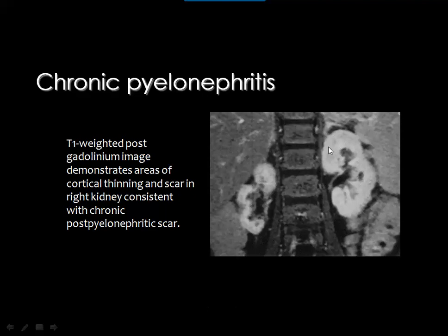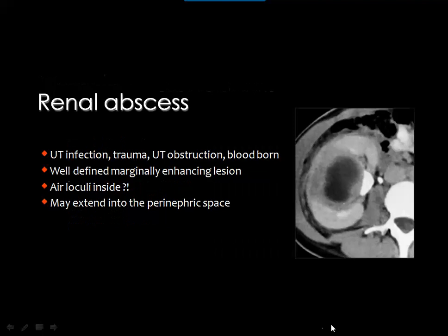This is the left kidney, which shows normal fetal lobulations. These indentations lie between the calyces, but this is a chronic pyelonephritic kidney. The kidney is very small, the renal outline is deformed with scar tissue here and there.